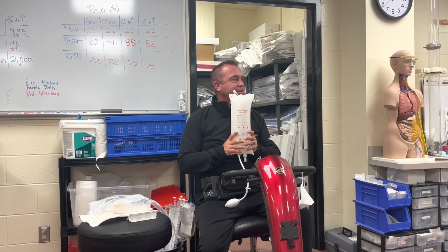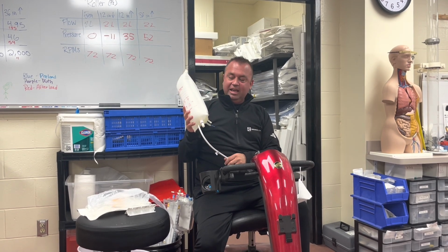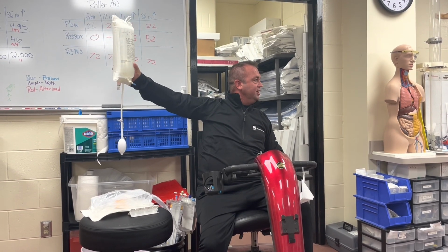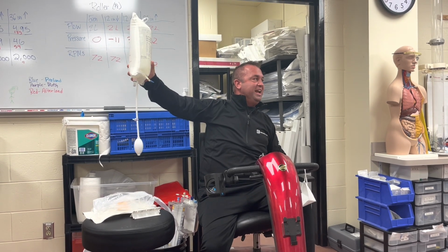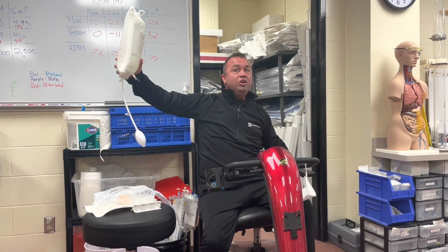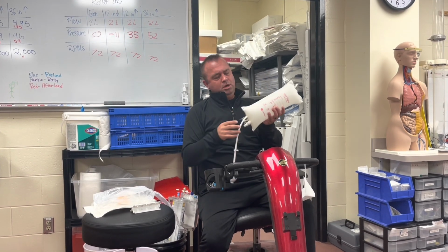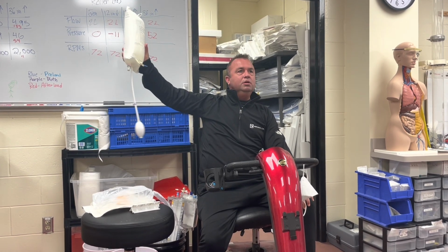Eiley, I'm going to try to stump Eiley. Since that's green over there, and I have this hanging over on a column, what can you as the perfusionist or somebody do to quickly check? I guess I kind of gave you the answer. You're going to for sure get this right now. So if we have this hanging over on an IV pole or someplace hanging on a column where our CO2 is going, we can look and see at the bag without going over and feeling it and checking. Yeah. Oh yeah, it still looks like 300. You can look and see that it's still in the green, which means it's high enough.